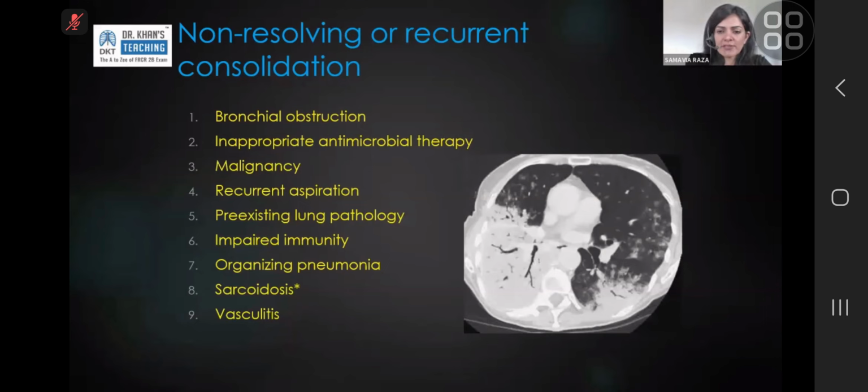What that means is the patient will come back and have a repeat of that same modality. When you see extensive changes like that, they can probably be followed up on a chest X-ray, because you can probably see them on the scanogram of the CT. If they are small enough, or behind the heart, or in a place that you wouldn't be able to see on a chest X-ray, the way to decide is to look at the scanogram. If you can't see them on the scanogram today, the likelihood of you being able to see them on a chest X-ray 6 weeks from now is extremely low. So there's no point recommending an X-ray.